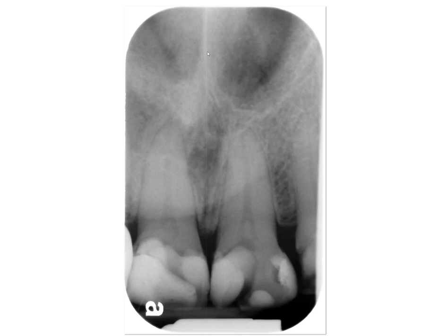Nasal septum here, and that's the nasal aperture or floor of the nasal cavity, where they come together, and especially in this area it's a little more radiopaque, isn't it? So that's the anterior nasal spine. Occasionally we can see the intermaxillary suture, but we have this weird radiopaque line which may represent, again, an artifact or scratch on the plate, that is almost masking the intermaxillary suture.